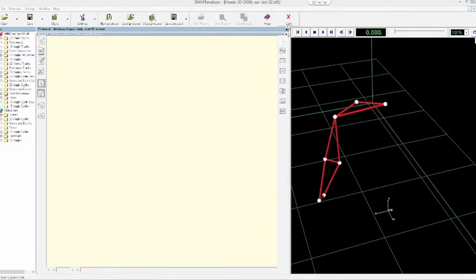show the other panel. The toolbar on the left contains the page editing tools used to create or delete pages, to change their order, for example, or to edit their headers. The toolbar on the right contains the graphical objects used to display the data, basically plots, tables, text boxes, legend boxes, cyclogram, images, and video.